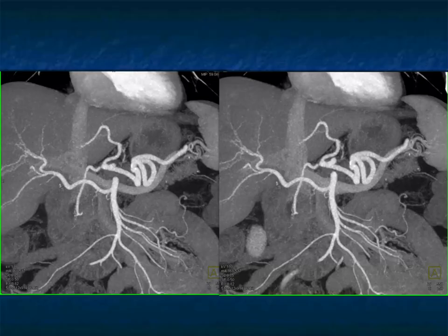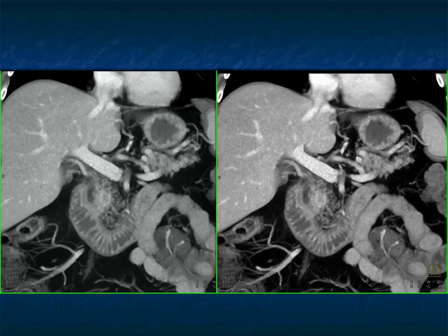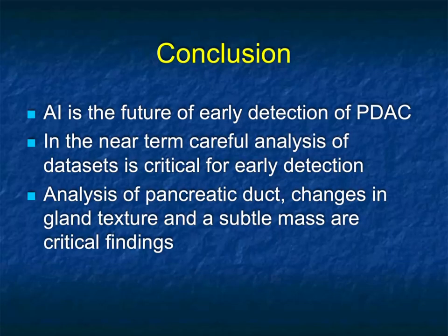Now, if you miss that lesion in the uncinate, the patient will have vascular invasion. So in this patient, there was no vascular invasion, replaced right hepatic off the SMA, nicely seen, and this patient will get a Whipple's procedure, and the patient is one of those who should be cured, hopefully. But again, this was 1.8 centimeters maximum dimension. You can see it's a different density than the fatty replaced pancreatic head. Very, very important. And again, the 3D mapping from the venous phase showing you the portal vein looks good, and other images would show you nicely the patient's SMV.